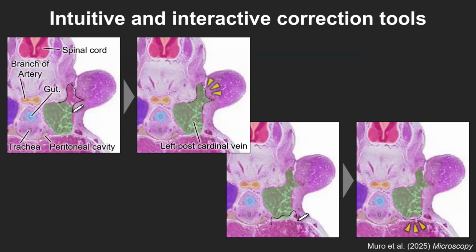The editing process is equipped with intuitive and interactive operations. For example, in the photo on the far left, there is a green-colored area. However, as a researcher, there are cases where the green area automatically colored by the AI is not enough, and you want it to be colored over a wider area. In that case, the users themselves will add the missing parts. Using the pen, draw the outline, and then press the Add Segmentation button to add a new area. This is like adding up.